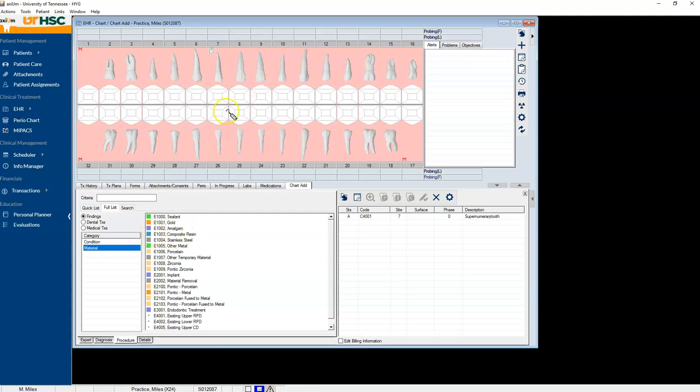There's composite. And it's going to also be, we'll look at tooth number 10. So we're always going to highlight our 10. So the composite is going to be a facial, a mesial, lingual, Class 3 composite. I will touch that and add that in. And you can see down here where I have my composite on the mesial, lingual, facial for number 10.